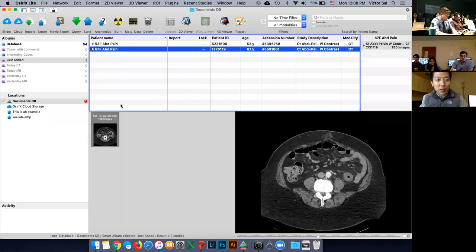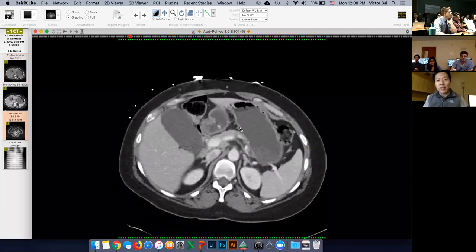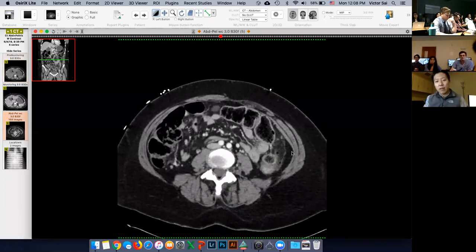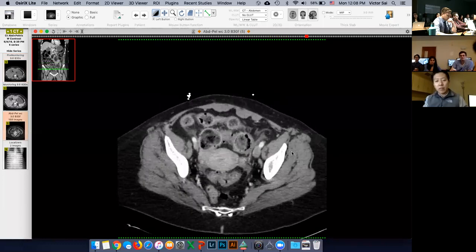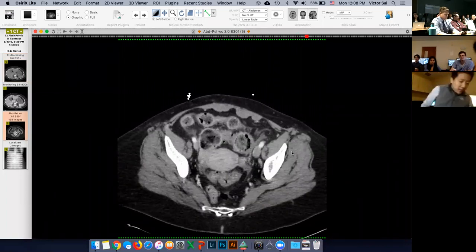Pretty similar theme here. Also, case of colitis. Sorry, I have a question regarding ischemic colitis. When I see cases, typically, or read a report, there's a differential diagnosis: colitis, infectious, inflammatory, ischemia. Is there a way to say if you think it's more of infection, inflammatory versus ischemia, instead of just giving a long list of DDX?